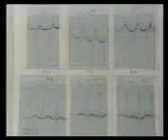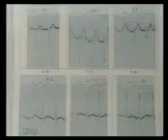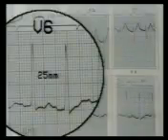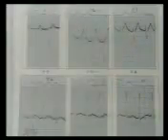This is another ECG where gross inspection of the chest leads immediately reveals that the amplitudes of QRS complexes is very high, but there is normal progression from negative deflection in V1 to positive deflection in V6. Now measure the amplitudes. SV1 is 21 millimeters. RV6 is 25 millimeters. So SV1 plus RV6 is 46 millimeters, which is more than 35 millimeters. So left ventricular hypertrophy is present.